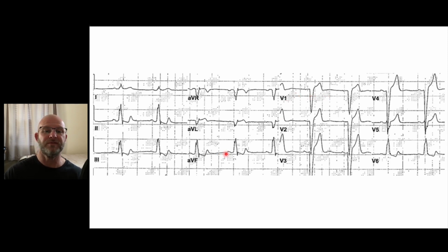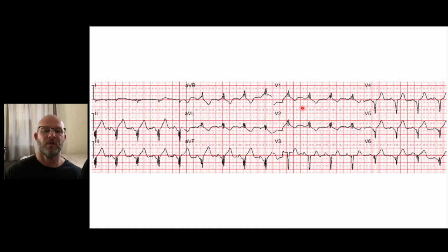There's a couple of EKGs to demonstrate that. We do have P waves, so we know we're on the wire at some point. Our QRS is wide. V1 is down, so this would be a left bundle branch block. And then right bundle branch block: we have P waves, so we know we're on the wiring, and our V1 is up, QRS is wide, therefore right bundle branch block.